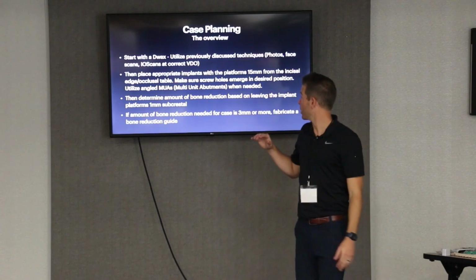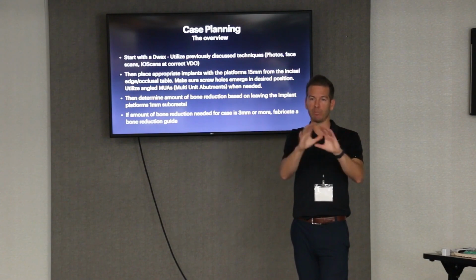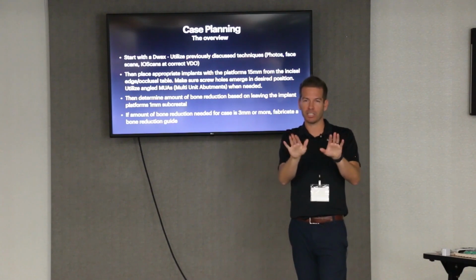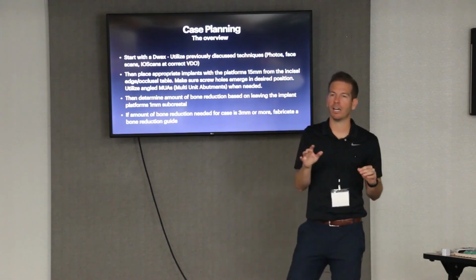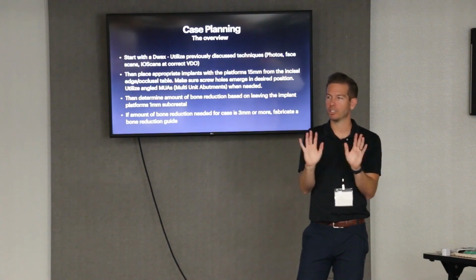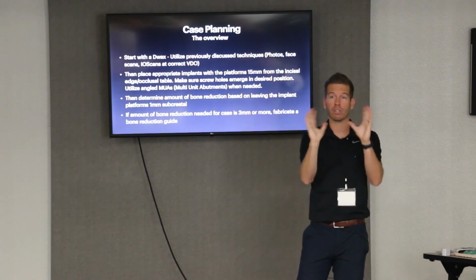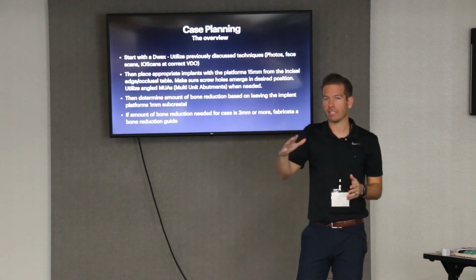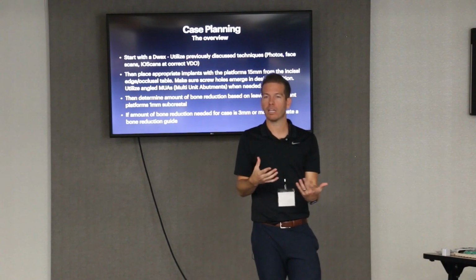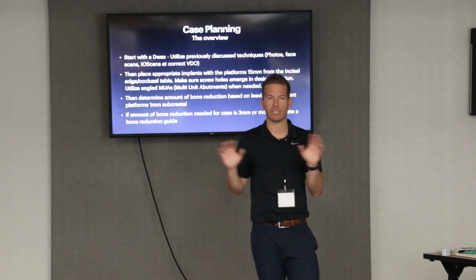And the cool thing is, when you get this wax up done and you have the teeth in the case, in the Blue Sky case, and you've looked at the photos and you've seen, okay, I want to change this and change the occlusal plane this way. You get your teeth in there, you lock them all, and now that's set for the case, right? You're not going back and changing the teeth, that's set. And then your implants then get planned within those confines. And then, the advanced stuff is where you actually then go and print those teeth into some sort of temporary that you might eventually transition that patient towards. So those teeth are locked and set for the case.